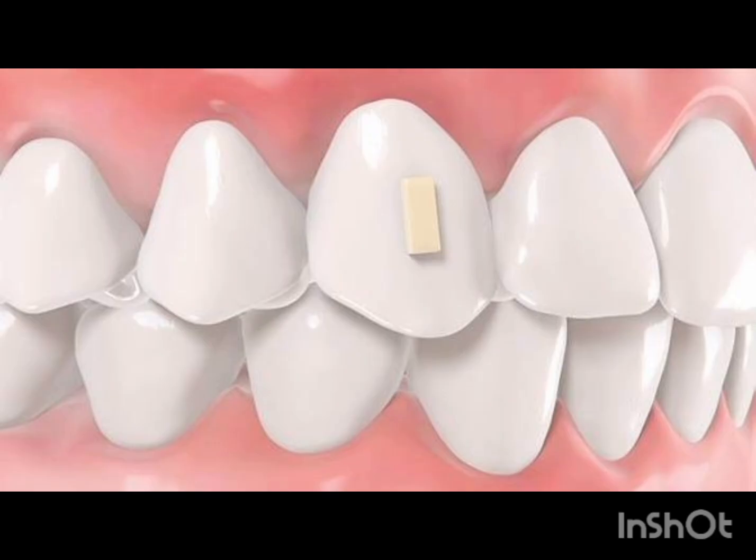Do not review only the first and the last aligners. Scroll through each treatment stage and evaluate the tooth tracking, rotation corrections, space closure, attachment engagement, root movements, and bite changes. This helps identify unrealistic movements from aligner fabrications.